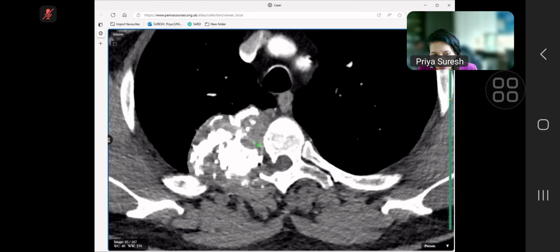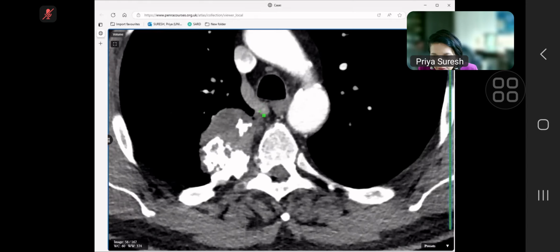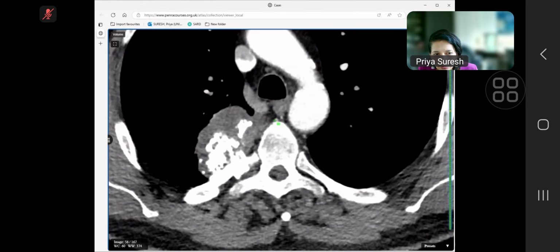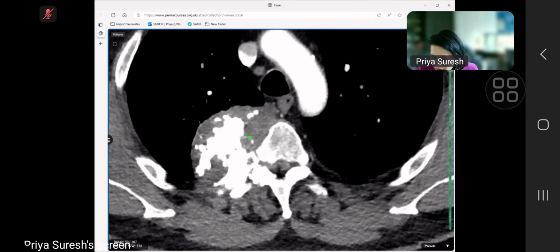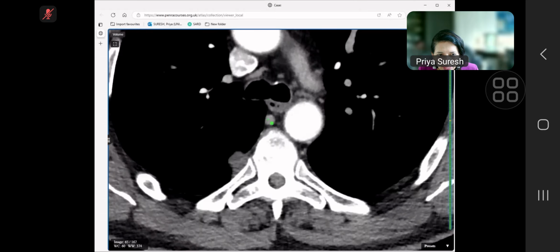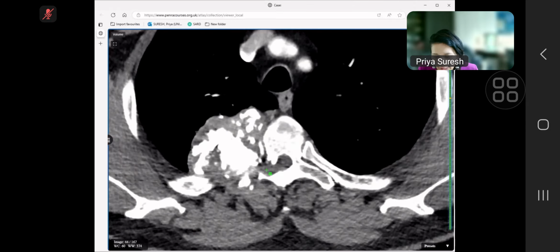Keep an eye on the critical structures. Even anteriorly, is it doing anything to the vessels there? Because those are the things that will harm the patient. If the tumor is just sitting there, not doing anything, that's fine. But if it starts going into the vital structures, that's where the trouble comes. Because it started going there, they had to operate, because he would develop symptoms. He hadn't at this point, but he would start developing symptoms. So that is chondrosarcoma of the rib.